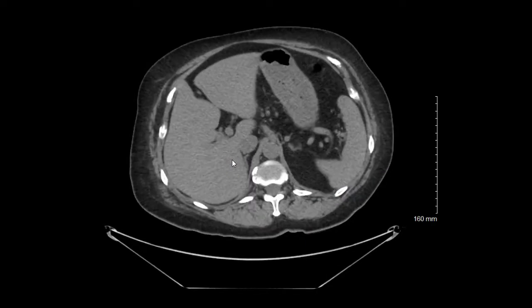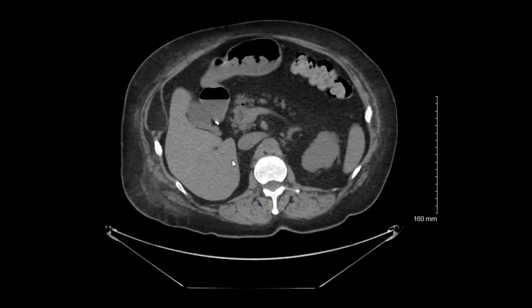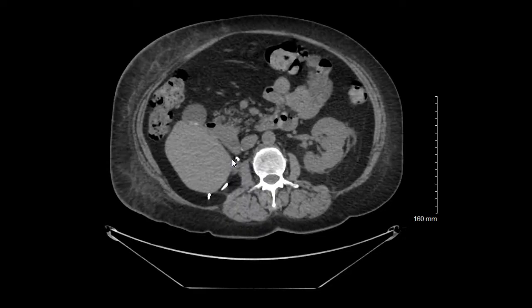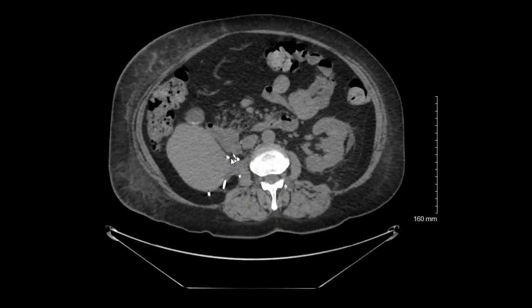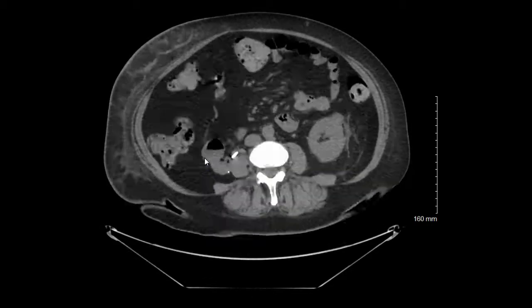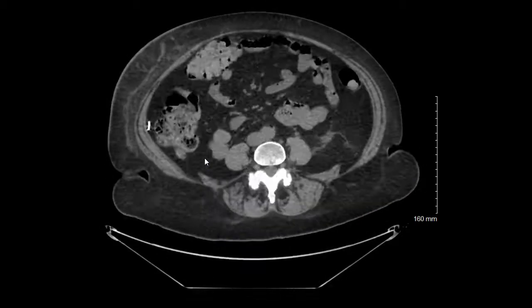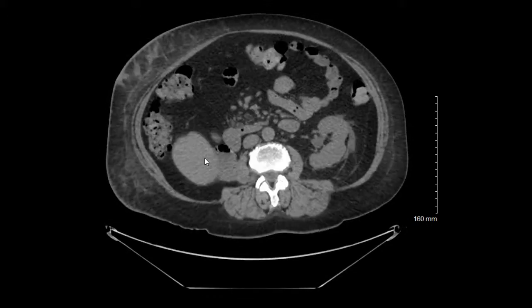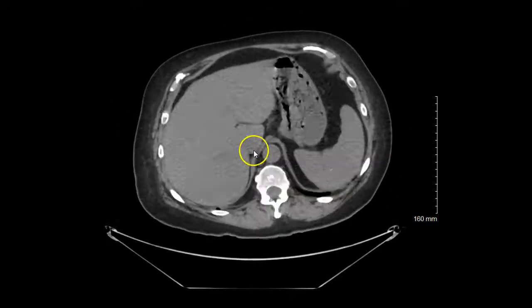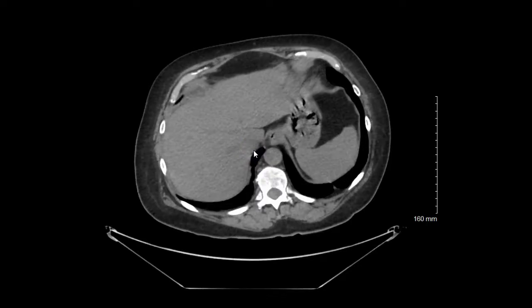And continuing to go down, we can see some of those structures that should be becoming more and more familiar to you based on what you currently know about different structures, where they're located within the body, etc. So the big idea though is that I want to break down some of the HUs associated with a given structure. So I'm going to find a nice slice here.